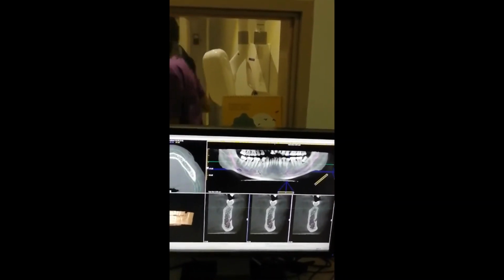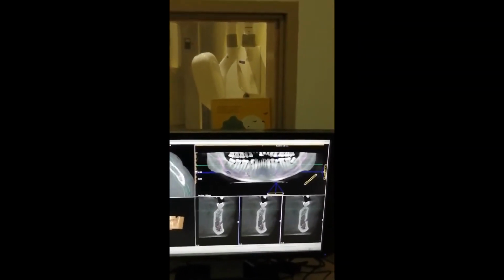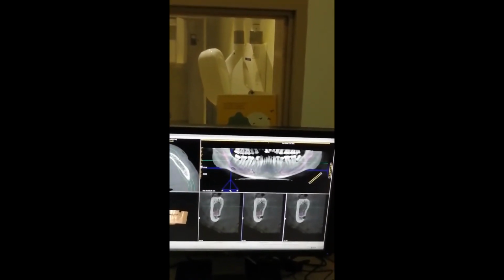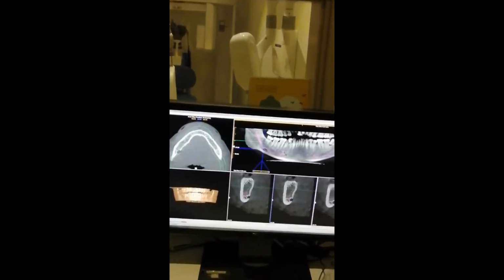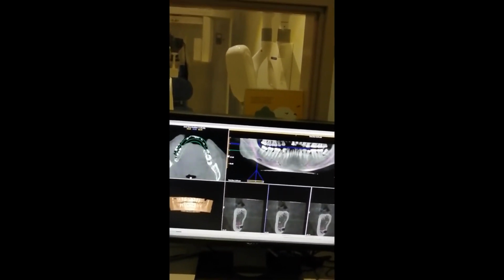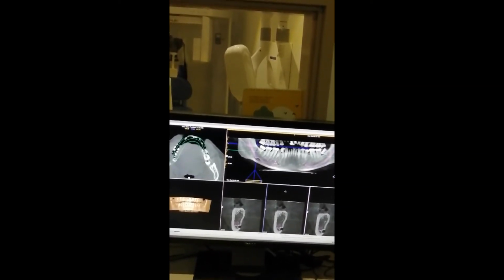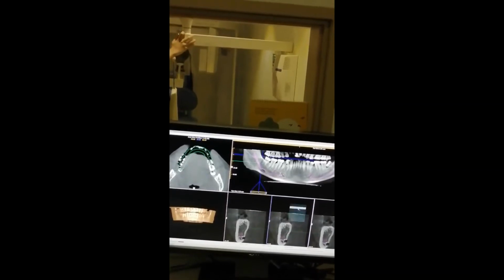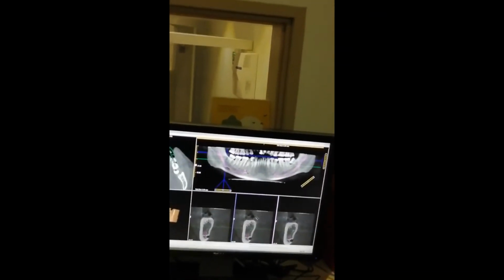Okay. Now done. So now if you want to put an implant over here, for example, it's a rough estimation. So drag it till here, then pull it up. Okay. Now see, this is a place for us to place an implant. Click, right click, distance. Distance to, that is for measurement.